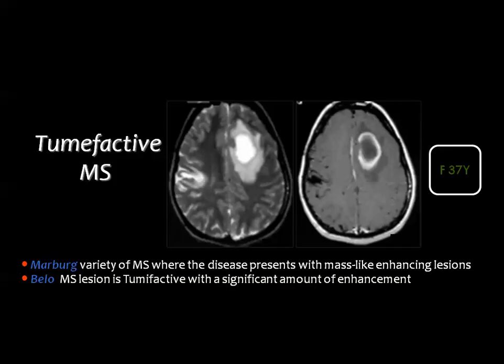And after injection of contrast, they show this very classic pattern of enhancement, which is in the form of an incomplete ring.